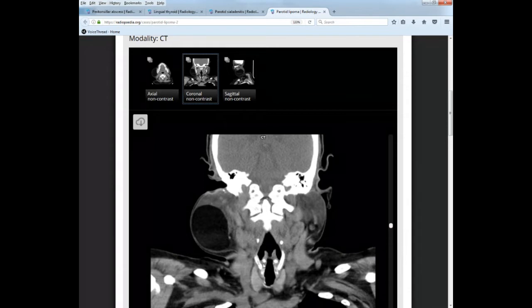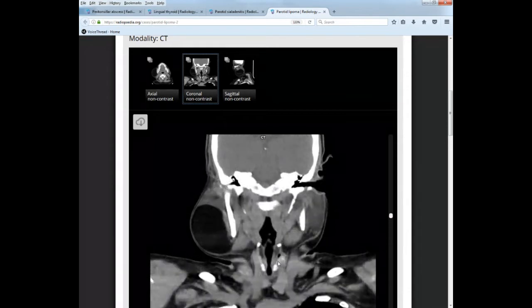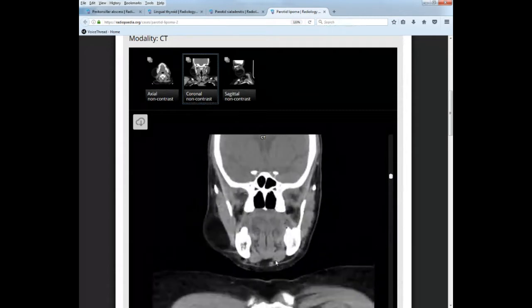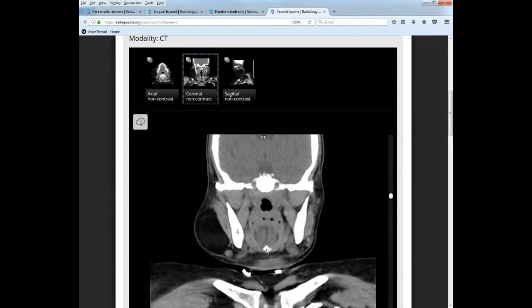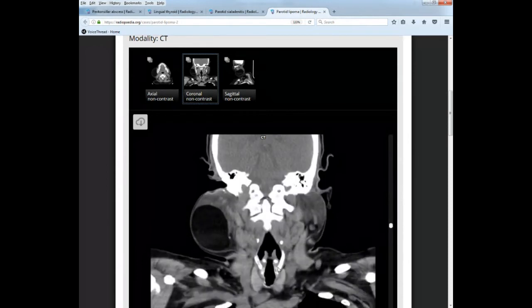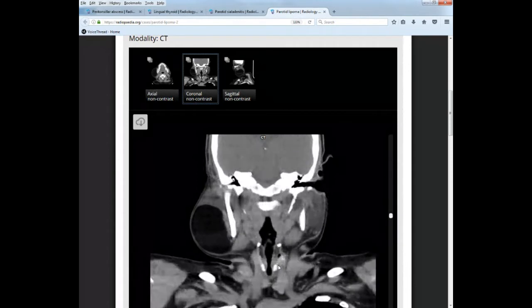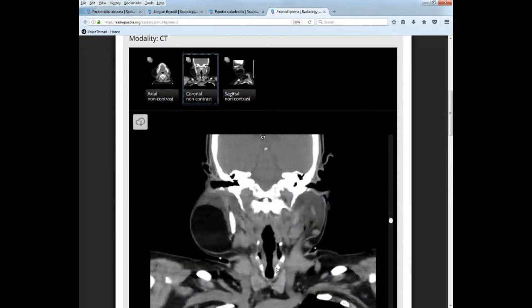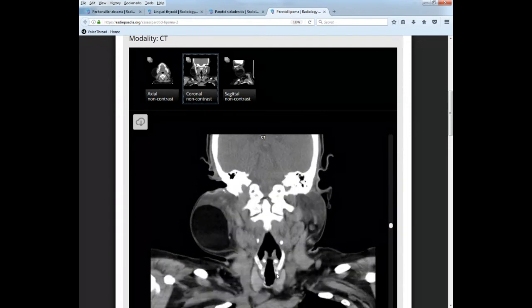Okay, and so now that I know that I'm in this area, let's go back anteriorly and let's look at the cartilage. Okay, so let's look at hyoid bone, should come in first. Here's hyoid. Just inferior to that is going to be my thyroid cartilage, which is here. Now anteriorly, you can barely make out little calcifications of the cartilage in here. Okay, and then as you go down, here's my cricoid coming in down here.